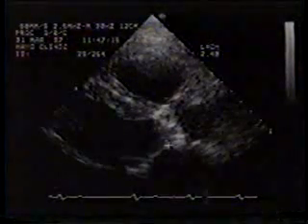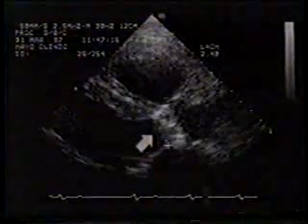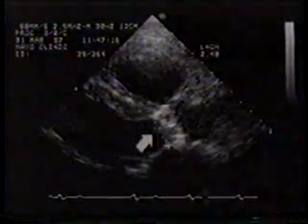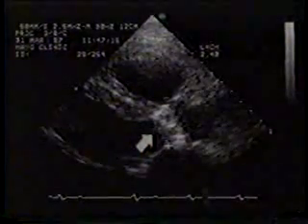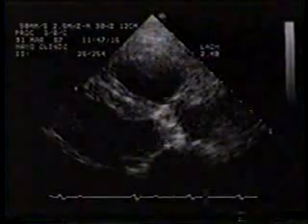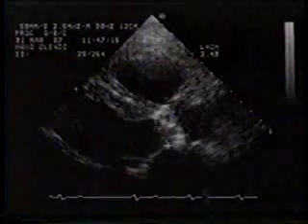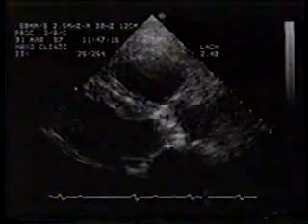As you can see, the LVOT diameter can vary significantly from one patient to another. Remember that any errors made in the diameter measurement will be squared in the valve area calculation. It is a good practice to average the LVOT diameter from measurements on 3 separate beats.